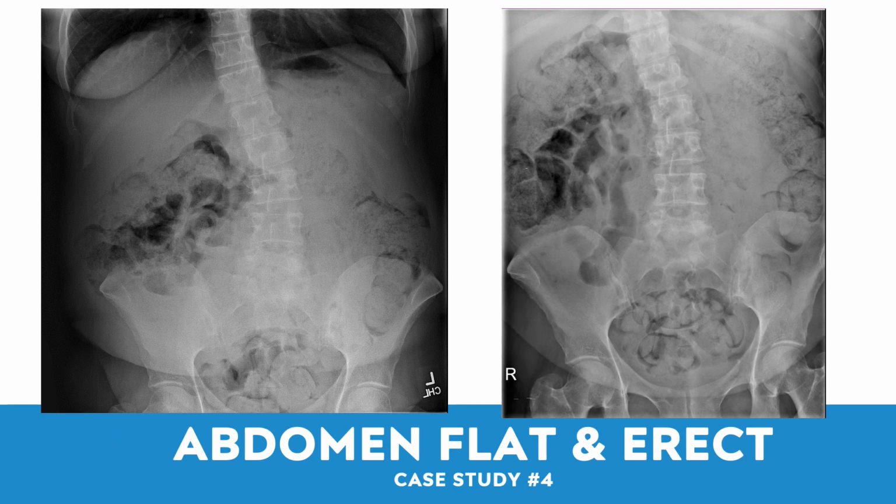Case study number 4, an abdomen flat and erect or decube, and this was a flat and erect performed. This patient is a 36-year-old female, history of abdomen pain and distension. The indication is abdomen distension, and they abuse narcotics.